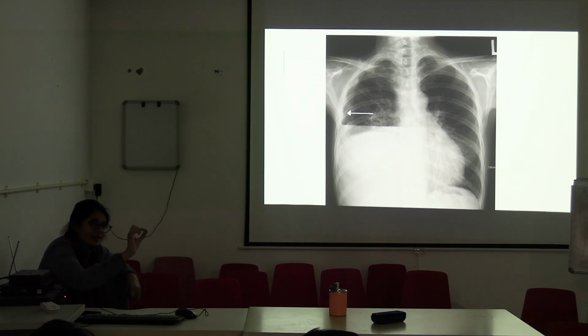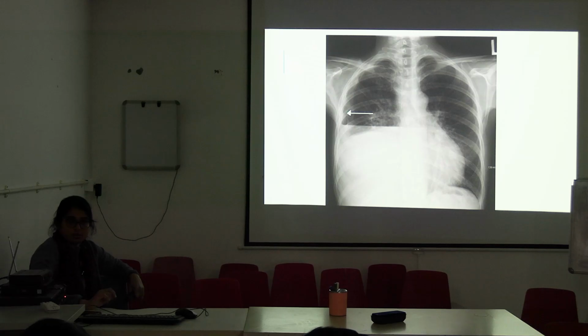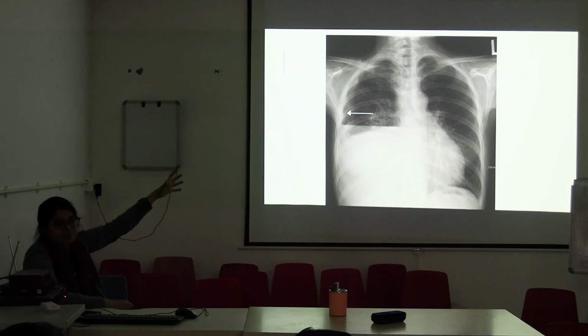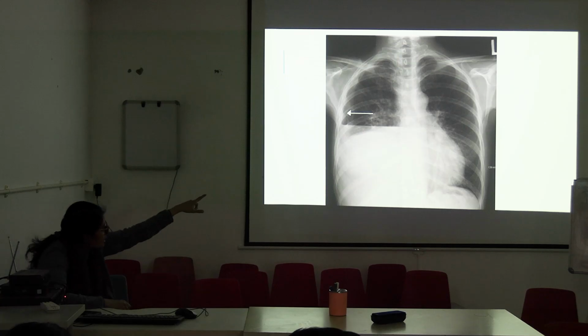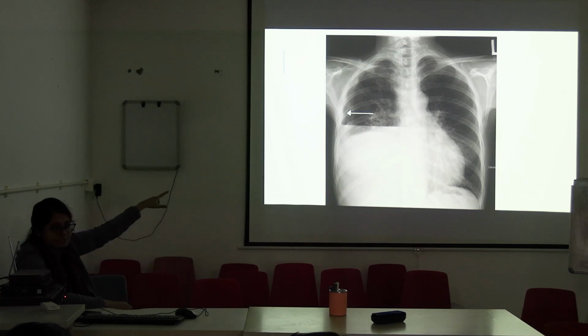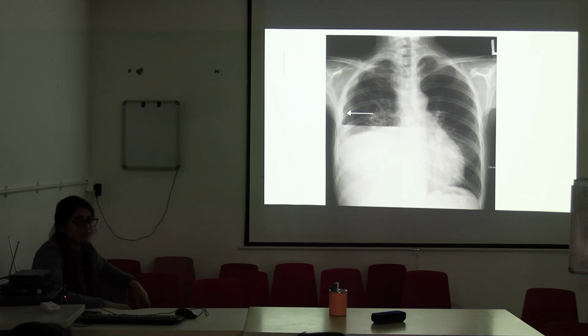Again in pneumatocele also the same thing. How will you differentiate abscess and pneumatocele? Abscess has a thick wall and pneumatocele has a thin wall. But this is something massive, and particularly this horizontal marking starting from the heart up to the chest wall is found in case of hydropneumothorax.